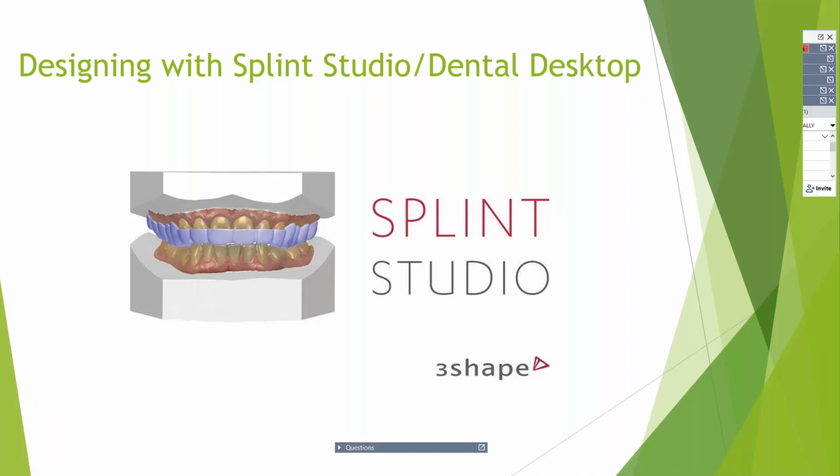So I do want to point out, in case for any of you that didn't already know, the new Splint Studio is actually kind of housed within 3Shape's Dental Desktop. If you're not already familiar with Dental Desktop, this is a separate software from your regular dental system, and it houses things like Implant Studio, for example, Smile Designer, and now Splint Studio. So the Splint Studio is its own module within Dental Desktop, which we're going to get into momentarily.